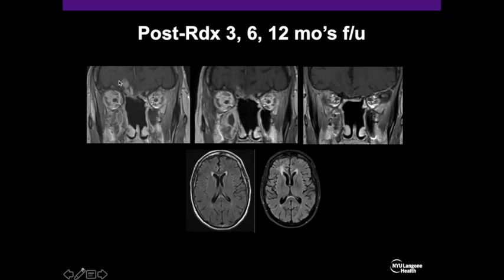We're looking at an enhancing nodule in the inferior frontal lobe and in the anterior cranial fossa. This is exactly where the mass was taken out. So for the most experienced radiologist, this probably is a slam dunk post-radiation change. But let's not forget, the enhancing nodule definitely resides where the primary mass was.